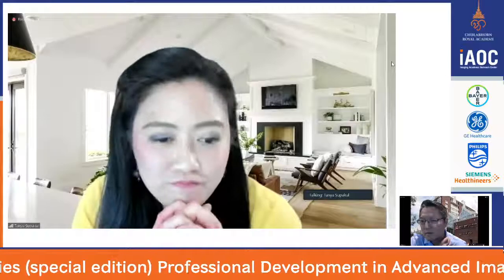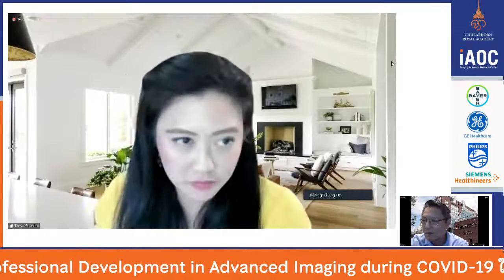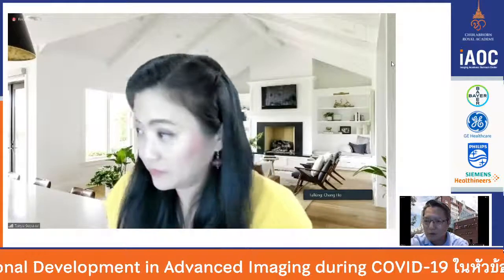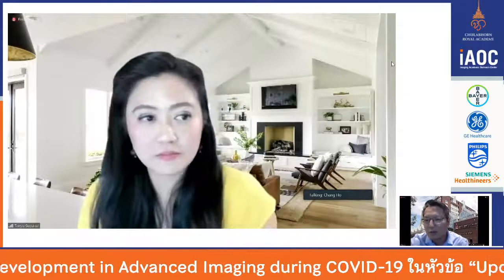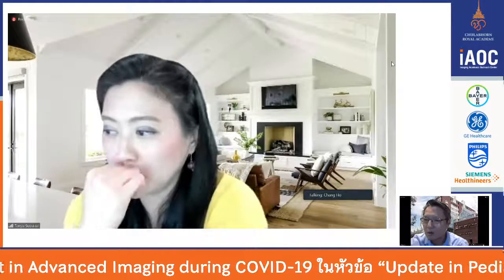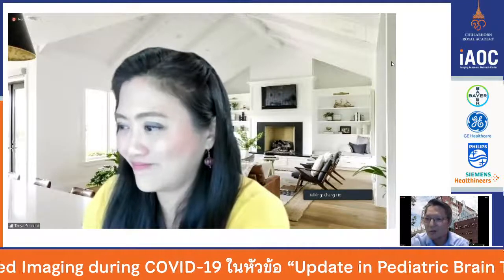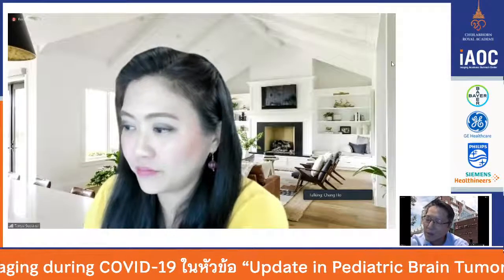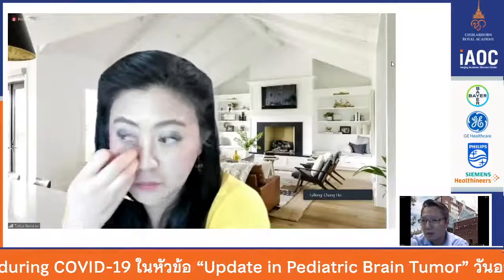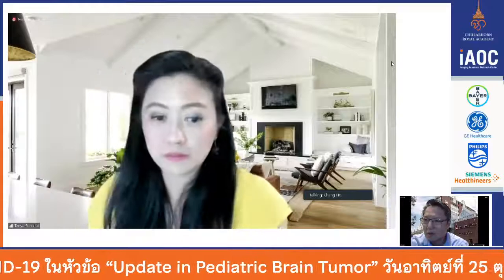Sure. Yeah, so we do a lot. We kind of throw the kitchen sink at it, as you know. So I would say the most mature techniques are going to be the contrasted techniques. I know a few years ago there was a lot of discussion of whether we should give contrast to our patients. And I think we shouldn't, as the American idiom goes, throw the baby out with the bathwater, right? Especially since these patients do have tumors. You're probably not going to evaluate them without contrast anyways.